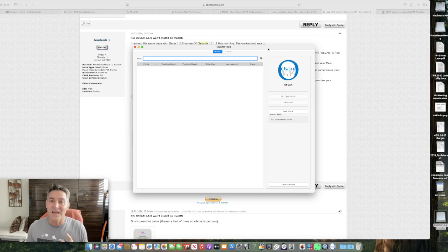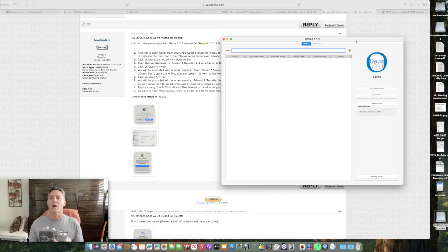Now, I do want to say one thing. I was getting a problem that kept giving these pop-ups of, where do you want to accept this information from? And it said you need to have an Oscar data folder. I kept hitting yes, and I kept hitting yes. Save yourself the trouble and hit no, no, no.